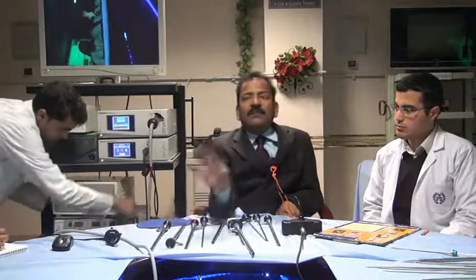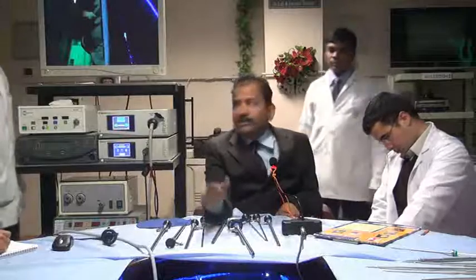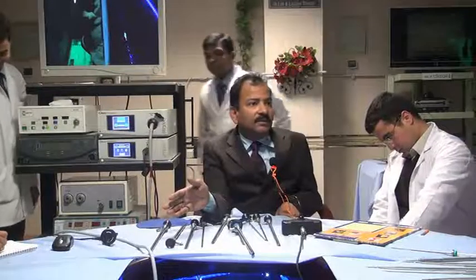Karl Storz makes 4 types of telescope. One is called E-class, that is the Ecoline series. Another is called top line. Then you have the HD. An E-class telescope you will get for 75,000 rupees. For top line it is 1.75 lakhs. For HD it is 2.5 lakhs rupees, which means approximately $5,000.